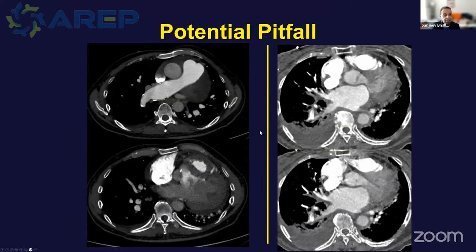I want to share with you another potential flow artifact. You'll notice in this patient, the patient has a very big heart, and this is because they have a decreased cardiac output and they've got a history of heart failure. You'll also notice that the pulmonary artery is opacified, but the aorta is not. And we see these filling defects, but these filling defects are in the anterior aspect of the pulmonary arteries. What these filling defects represent are flow, but they're flow from bronchial arteries.